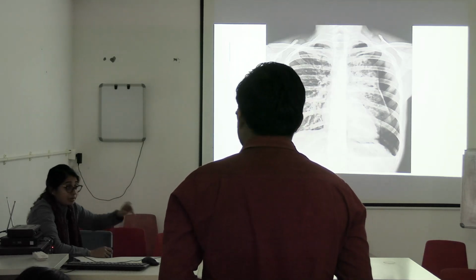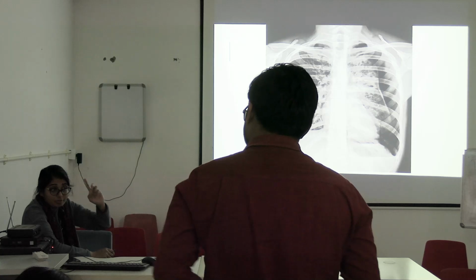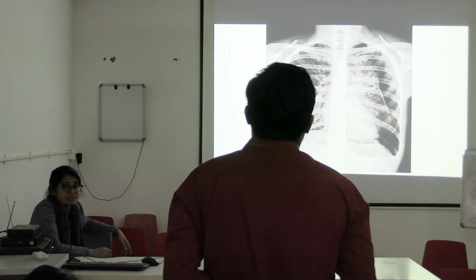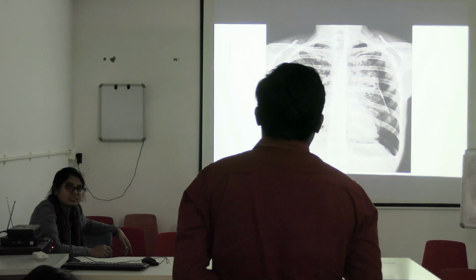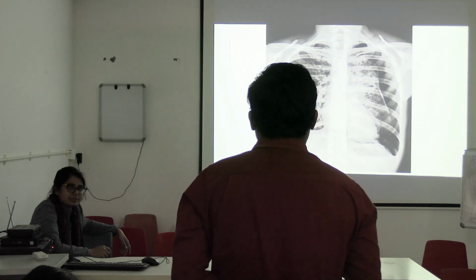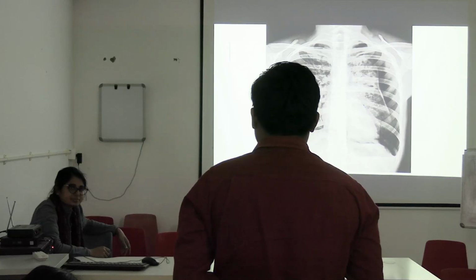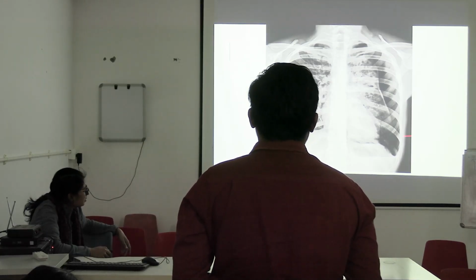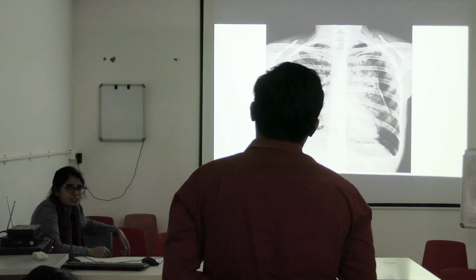Okay, the lung এর ক্ষেত্রে ফার্স্টে we talked about lung fields, then position of the mediastinum. Describe the position of the mediastinum. The mediastinum is shifted towards the right. Slightly shifted to the right. Okay. And the trachea is deviated towards the left. Okay, ঠিক আছে। Do you want to comment on the heart, cardiac shadow?